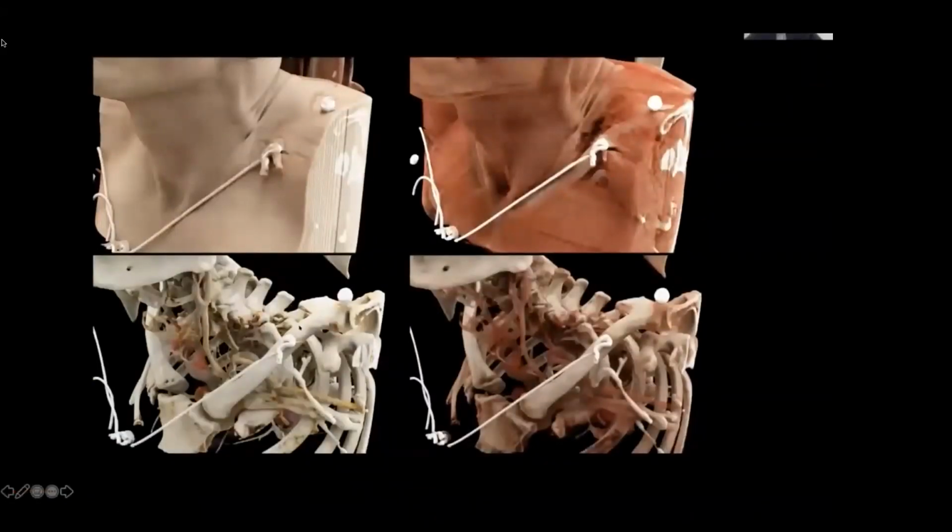So just to, sorry, question? I was going to ask just a quick question regarding this topic specifically, if that's okay. Sure. I've seen this a lot on my rotations, and it's always been super exciting and super helpful. Maybe from your perspective, a question I've always had is, can we totally rely on these 3D reconstructions for their anatomy? How accurate are they in your opinion? Can we depend on these things when we're thinking about surgical approaches?